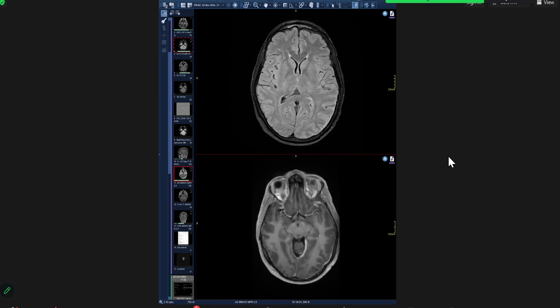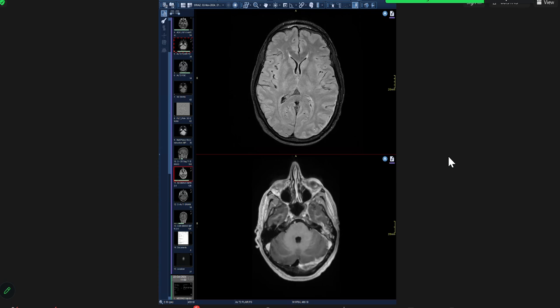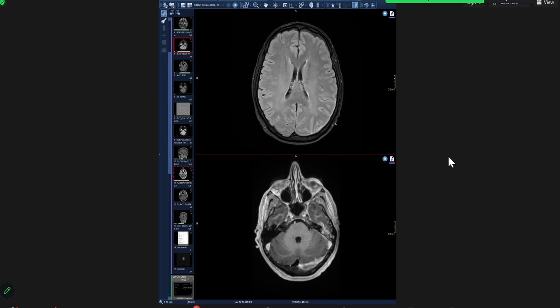So if you had not seen this and you had seen that there is meningitis, or you see asymmetric enhancement, you say, I want to exclude blood. You want to ask whether the patient was given any contrast, because if you do FLAIR post contrast, you can also have this kind of thing there.